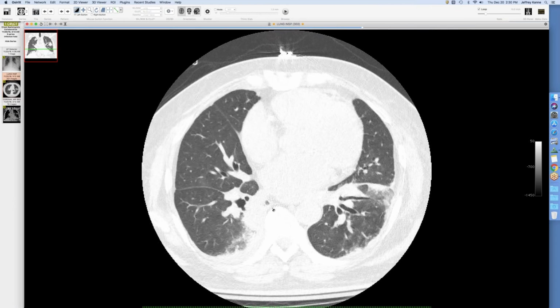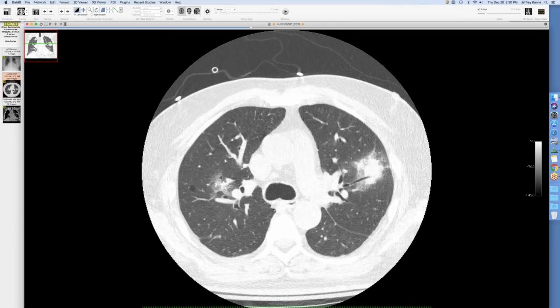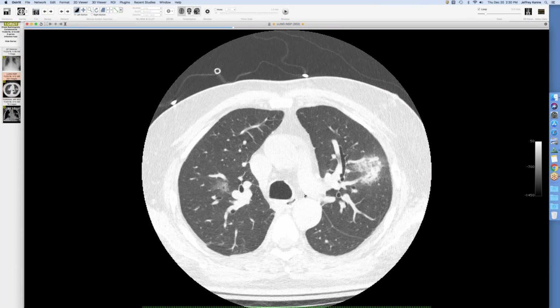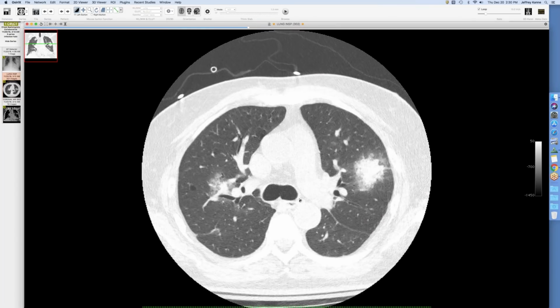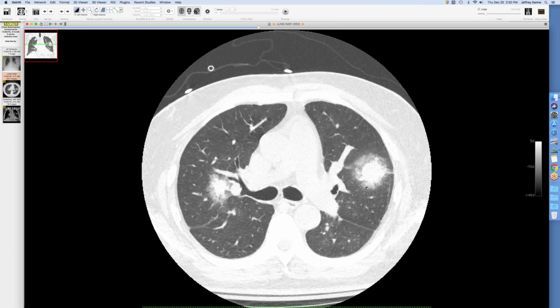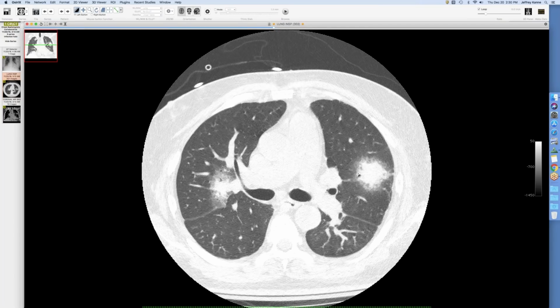But I checked all the fungal markers and everything was normal. They treated him pretty well. So this is all Legionella. And I came across this case because I read the follow-up, and it's all gone with appropriate antibiotic therapy. But I thought this was a neat case because I've not seen the more community-acquired version of Legionella look like halo signs. This definitely looks like micdadei.